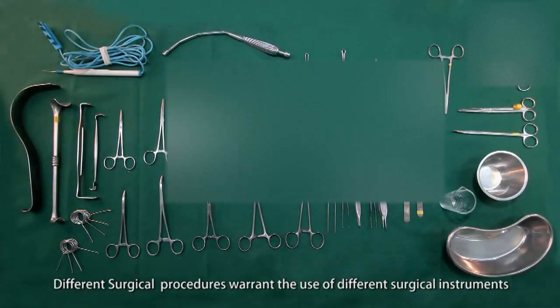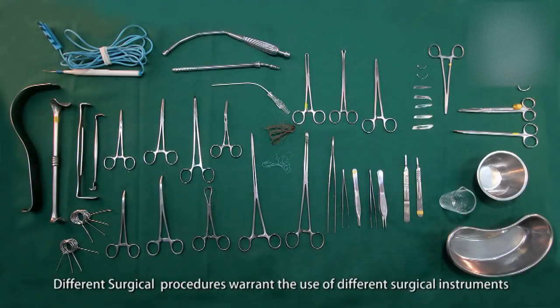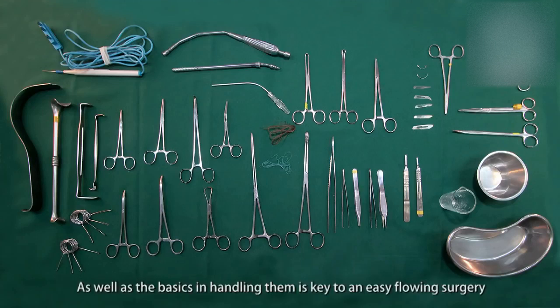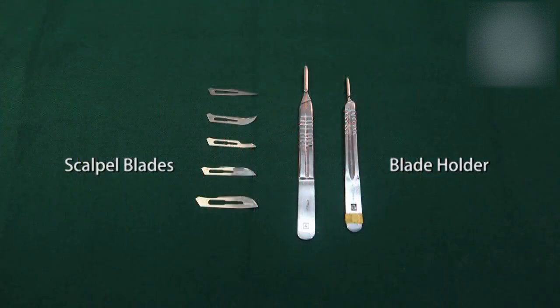Basic surgical instruments. Different surgical procedures warrant the use of different surgical instruments. Knowing each instrument and its functions, as well as the basics in handling them, is the key to an easy flowing surgery. Scalpel blades. Blade holder.